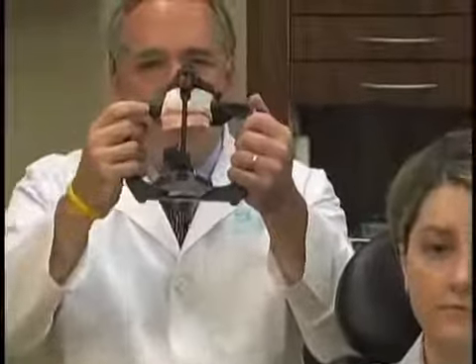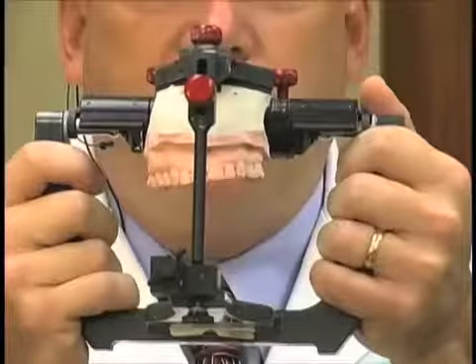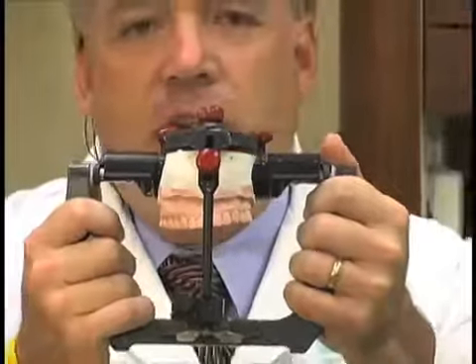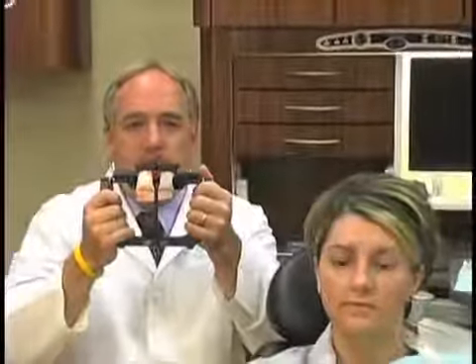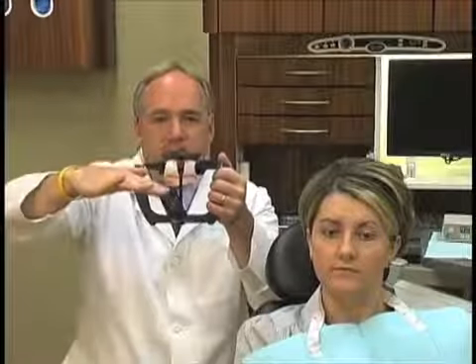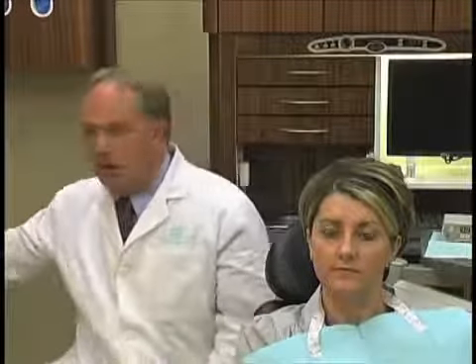This is a really nice example of a patient that we're doing on Monday. And you look at this guy's maxillary occlusal plane, and there is an absolute tremendous cant to it. Now, in the photographic section, I'm going to show you a photograph we take to make sure that if we see a cant like this, that it actually exists in the patient. We actually call it our Facebow verification photograph, and I'll go over that with you in another segment. But the point here is this patient is having this work done to correct it. Since this maxillary cast is mounted properly, when I correct this plane, when I put the provisionals in the patient's head, he's going to be level. And that, to me, is one of the most important things.